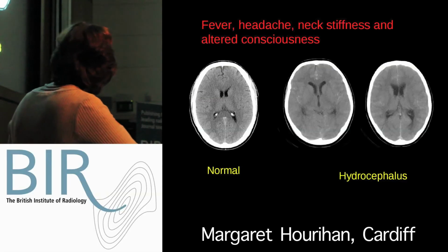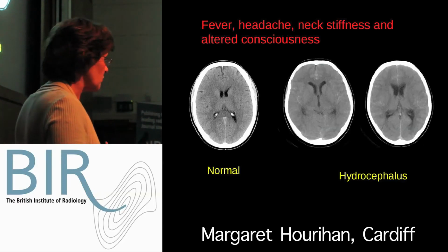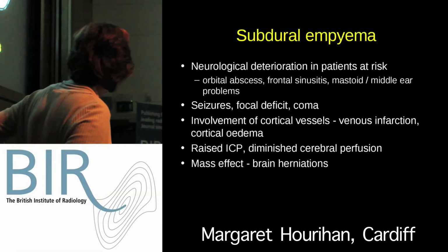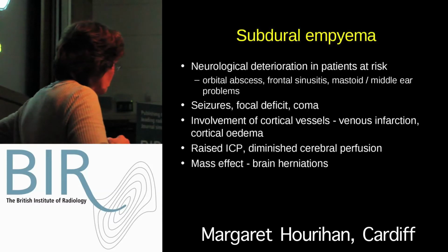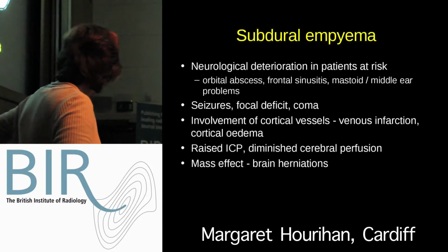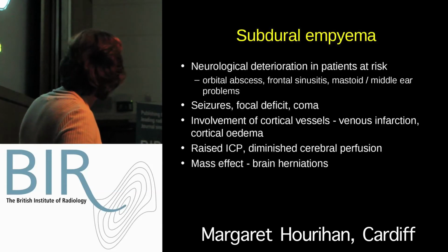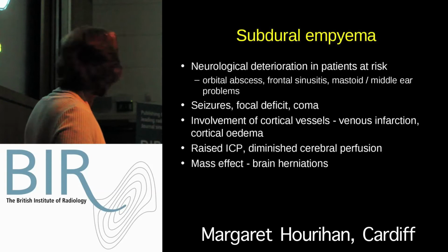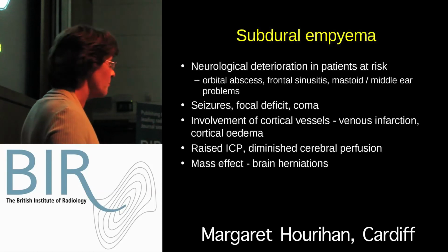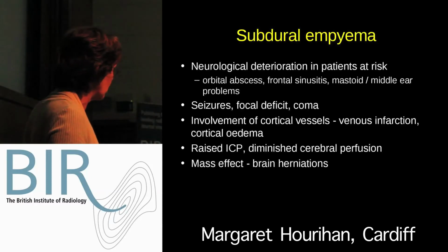So normally, we do a CT within working days, but after midnight we don't do them. Unless there's a contraindication, just get on and treat the patient, we'll scan the patient the next day. Then the CT is usually normal, but you may see hydrocephalus. The thing about hydrocephalus is that, if the clinical scenario is correct and you see hydrocephalus like this, you can say it's communicating hydrocephalus, most likely to be related to meningitis. But if you haven't got that history, don't forget that the patient may have had a subarachnoid hemorrhage as well, so the patient definitely needs an LP to make the diagnosis.